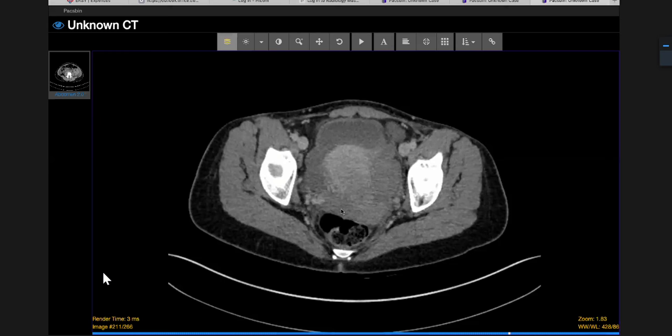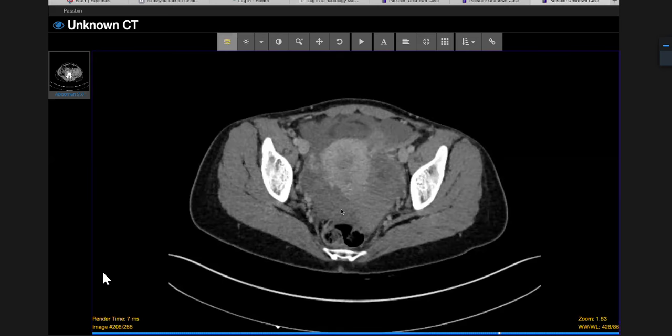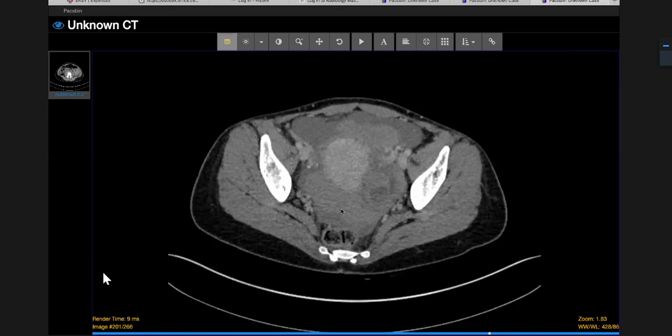As you pointed out, the uterus is quite prominent, but if you look in the left adnexa, what's all that swirling going on there? There's lots of mixed blood products there, and that's where it's coming from. I think that's pretty much as far as CT can take you. CT is not the best modality for pelvic organs, is it?